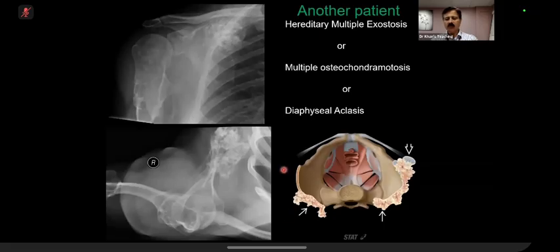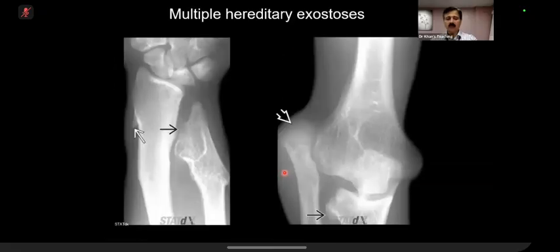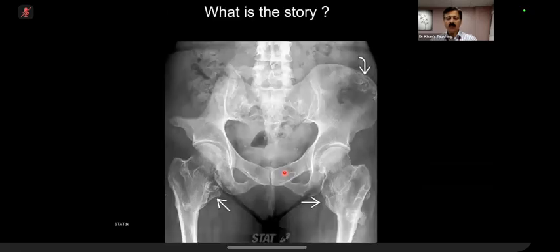They will show you a case in which there is malignant transformation. There is a bit of discrepancy in literature. Some people think up to 10%, and there are other studies also. So they will show you cases in which there is malignant transformation. And if you see, this is a type of case you should expect in the exam.